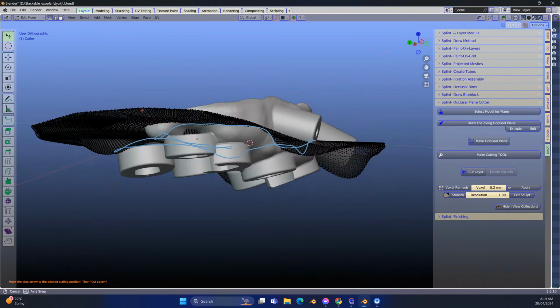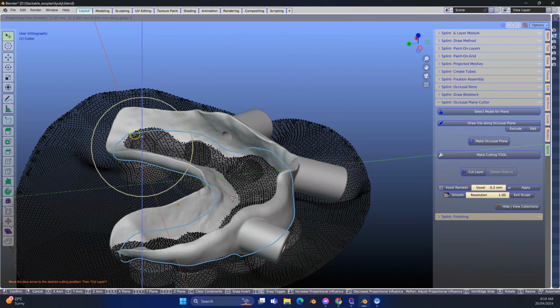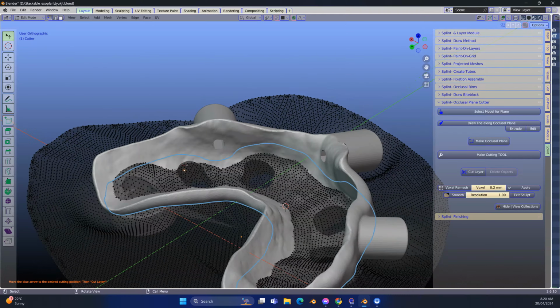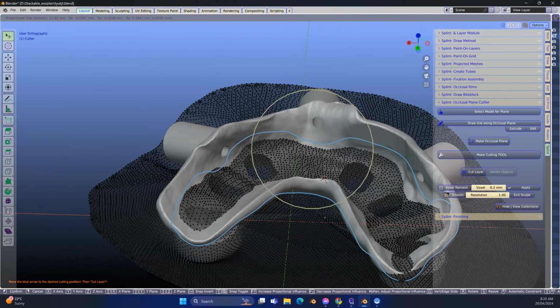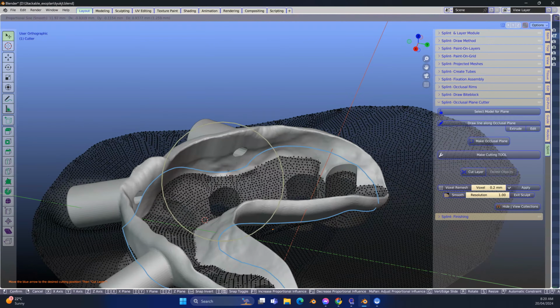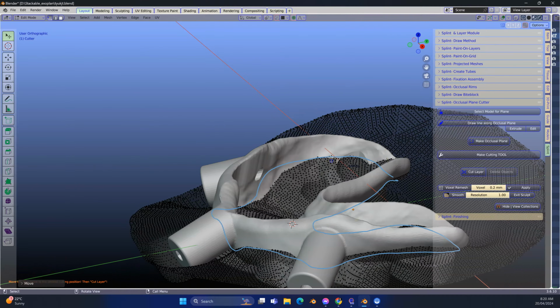So here I want to try and visualize how this cut is going to end up. So I'm using the GZ key now. Spend a little bit of time on this because you cannot go back. Once you've made the cut, you're committed to it, and always save your files, because if you do make a mistake, you can go back and start off at a strategic position.